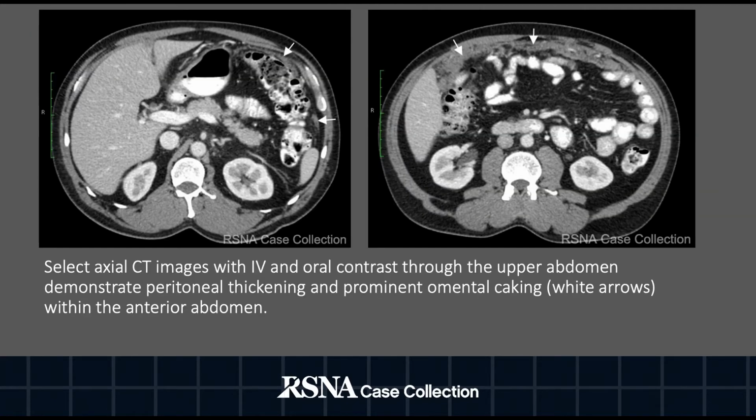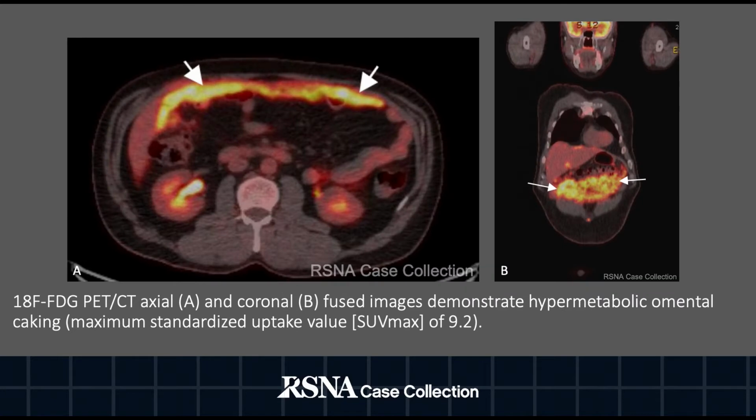Select axial CT images with IV and oral contrast through the upper abdomen demonstrate peritoneal thickening and prominent omental caking within the anterior abdomen, as shown by the white arrows. FDG PET CT axial and coronal fused images demonstrate hypermetabolic omental caking with maximum standardized uptake value of 9.2, as depicted by the white arrows.